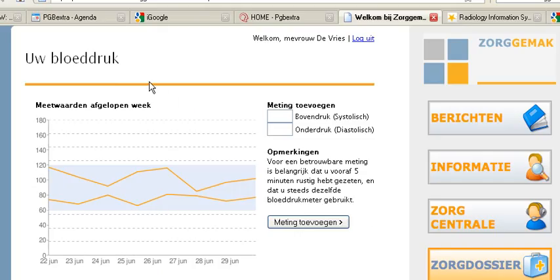So here you see the next user interface which Jorn has actually built. You see buttons on the right side. I think this is better for most user interfaces. Now you can actually use a USB phone to hang on the left hand side. Here you see the normal blood pressure, which is being built a bit easier.